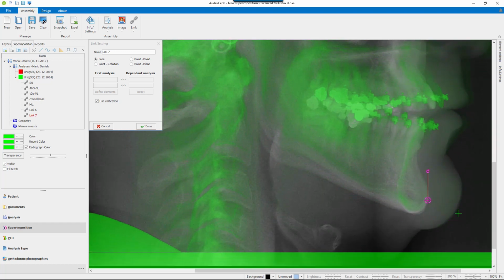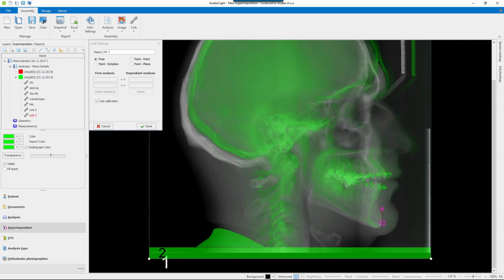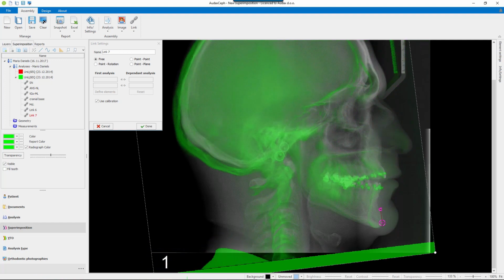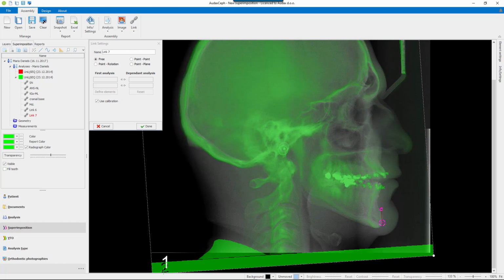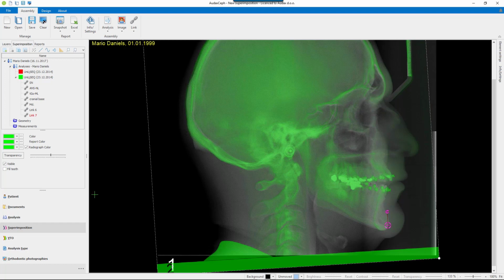I have to zoom in, something like this. And now I'm going to do the rotation. This can be particularly useful if there is no growth. So the patients without the growth, we don't need to do that. Something like this. I hope that I placed that correctly.